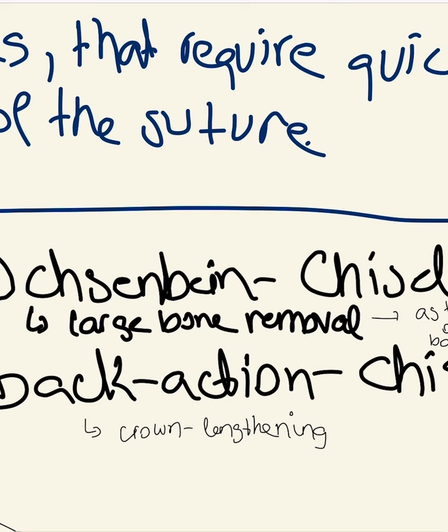For reduced or limited access, we use bone files, also called periodontal files. We have the Sugarman bone file and the Schluger bone file. The Sugarman bone file is straight, and the Schluger bone file is angled. The main difference between these chisels and files is the accessibility. We have open, permitted accessibility with the chisels, and limited, reduced accessibility with the periodontal files.